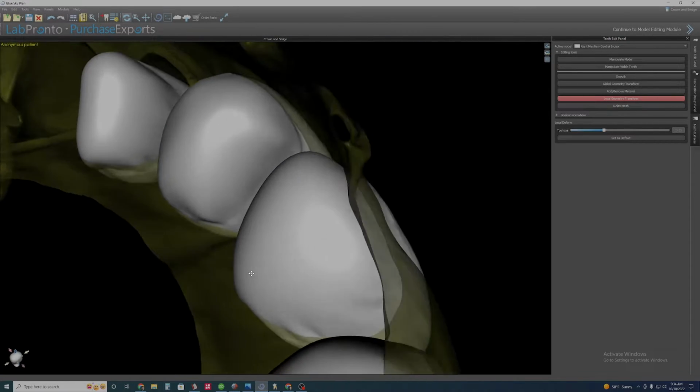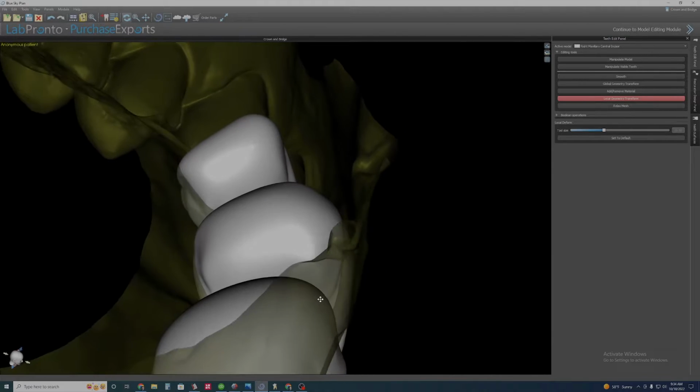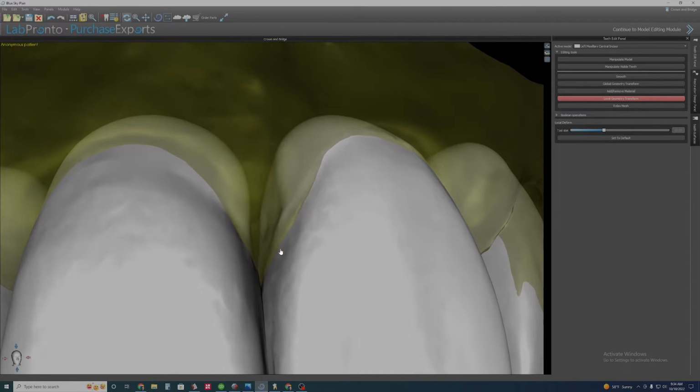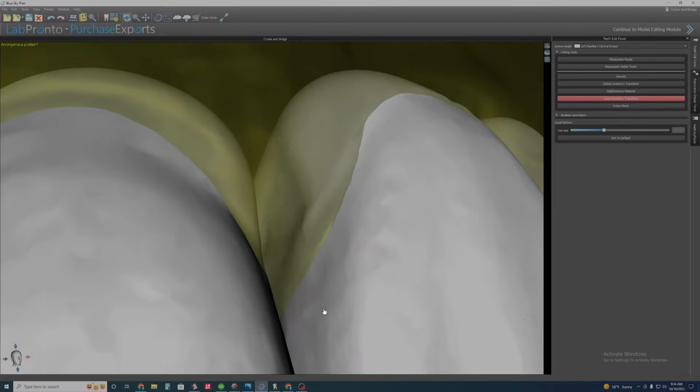And you can tell that there's pieces of the tooth underneath, which obviously doesn't really matter how that's shaped, but it helps to be able to grab that beyond the model. Because if I grab right here, it's a lot more dramatic when I'm changing things as opposed to right here, especially when I'm trying to get very subtle things done on the margins.